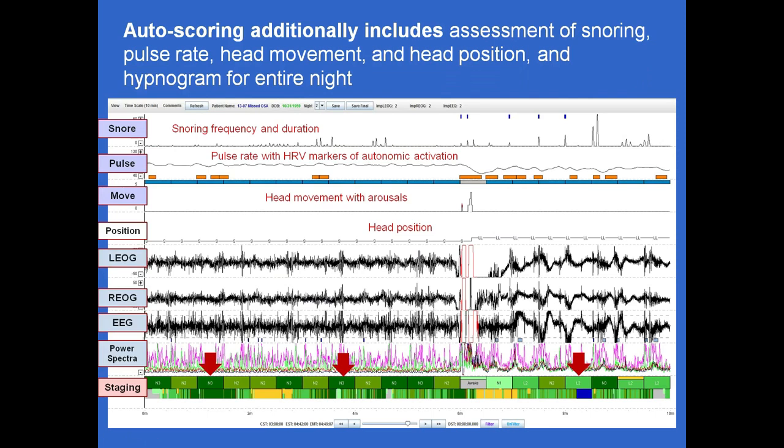The signals presented in the upper portion of the screen provide behavioral measures of sleep continuity. The signals used to stage sleep are presented in the lower half of the screen. The upper hypnogram identifies the stages associated with the current screen presentation, and the lower hypnogram presents the entire night, with blue markings to identify the location of the current screen with respect to the entire record.